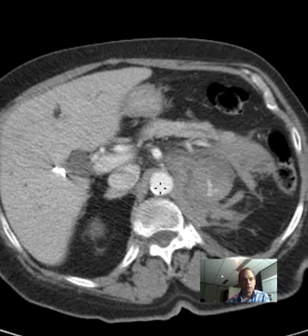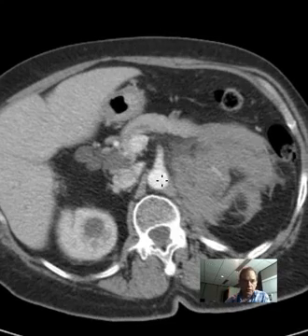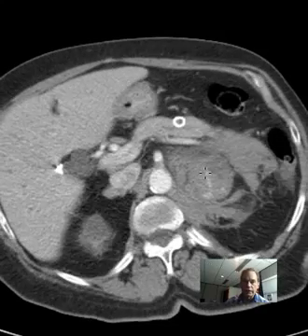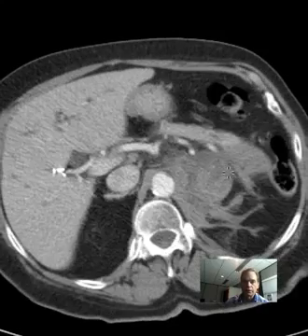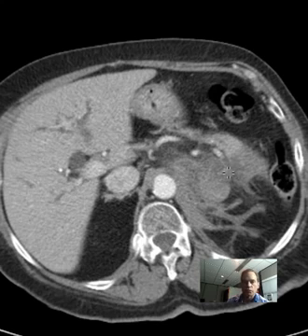Well, we have just put dense contrast in the vascular system, so just like where the branch from the aorta branches there are clearly high density because of the IV contrast, so if this were to squirt out of the aorta or out of any other artery, it would also be high density, high attenuation, because it's contrast opacified blood.